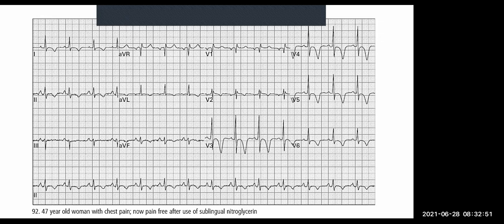So number one, are you already worried? Even if we haven't gone any further, just my question to you guys. Would you put this patient on antibiotics and Panado and go home? Okay, that's good. Just know you're not going to do that. That's fine. All right. There is something going on with this heart, even if you don't know what exactly it is. All right. And we'll get to what it is just now. All right. So let's see.